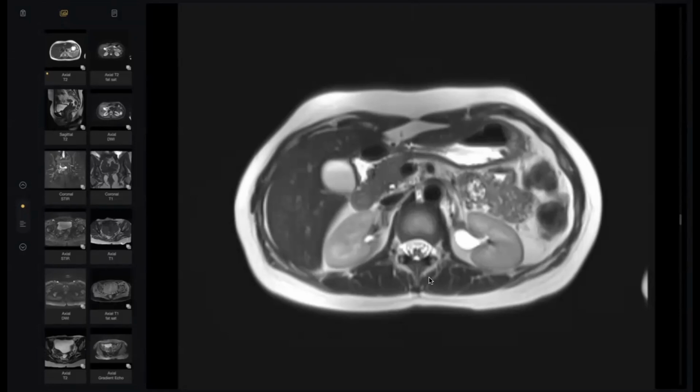So, give me your diagnosis, please. Sir, I would like to see the above and lower images to check if there is any ectopic pancreas associated, based on the current image only. No ectopic. Give me final diagnosis. So this is bicornuate unicollis uterus with a rudimentary horn and the dilated other horn, with partial agenesis of pancreas and some prominent hydronephrosis on the left side.